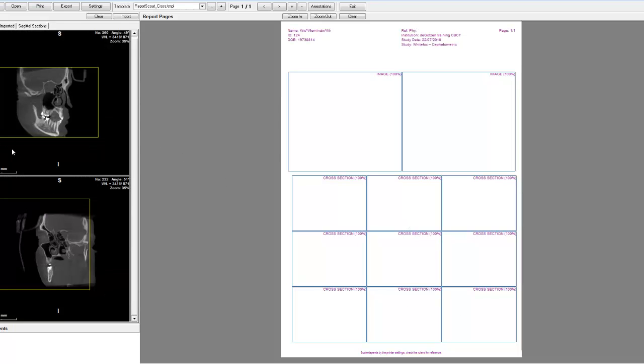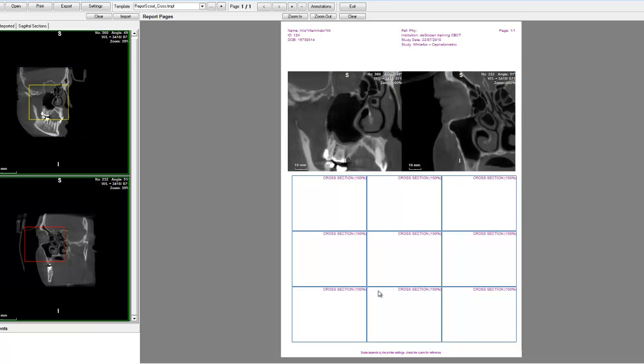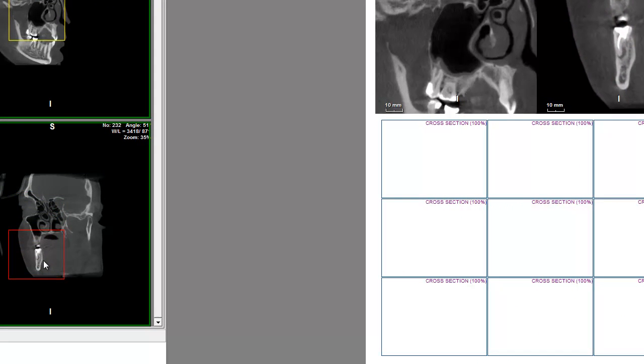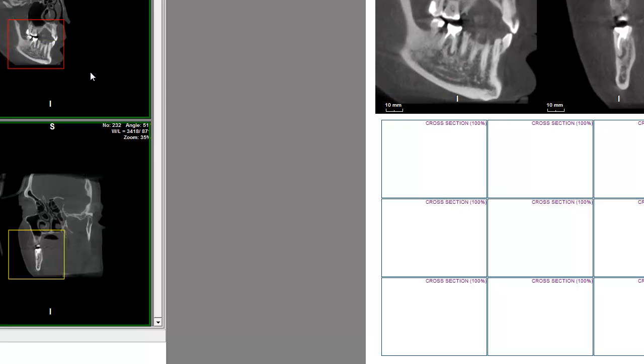you can simply extract your images by drag and drop. Let's do that quickly here. As you can see, they are not centered. Here you always get the square, but that can be corrected easily. For example, this one here and this one here. Okay, so I get here a nice image that I need.